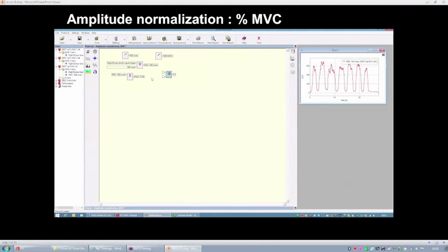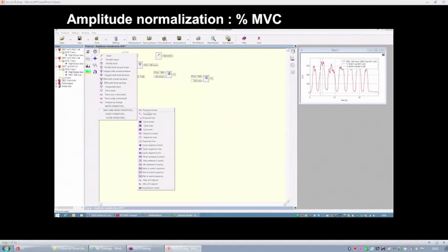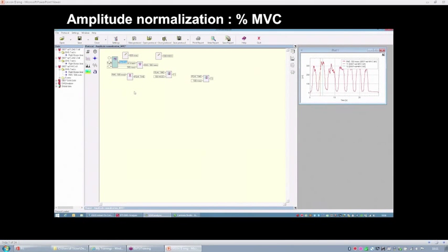Now I'm defining the two temporal events. The first is the peak time minus 500 milliseconds, and the second will be T2 as the peak time value plus 500 milliseconds. So we are going to consider a period of 1 second around the position of the peak. And now I'm going to compute the average value in this period. So use mean value between two events.